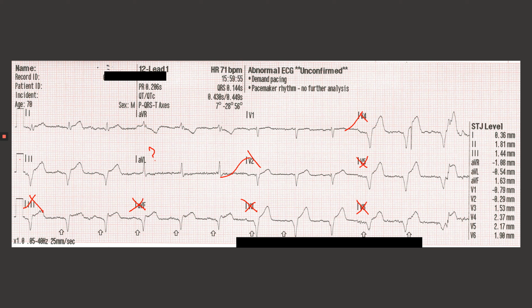Discordant, discordant, discordant. Then we get to here. Isoelectric line starting from the start of the QRS going across. QRS is going up. T wave is going up. We are concordant right here. So according to this, that's a positive finding. And it should be noted that this particular patient was experiencing chest pain. They were presenting like it. They're not just sitting there doing nothing, but this is a positive finding. So we're going to say, this meets this criteria here, so we would err on that side.